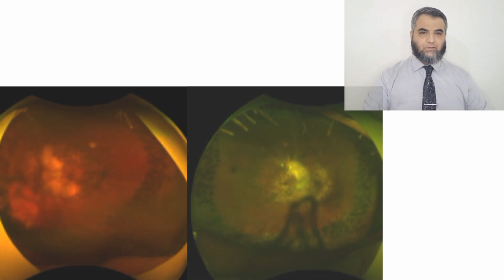Apart from the cicatricial ectropion, just to mention, these are the fundus photographs of the same patient. You can see retinal degeneration in both eyes, and he has laser barrage, most likely for peripheral strengthening because of myopic changes or a peripheral lesion. So he also had laser barrage in the periphery in both eyes, and some central degenerative changes in the retina.